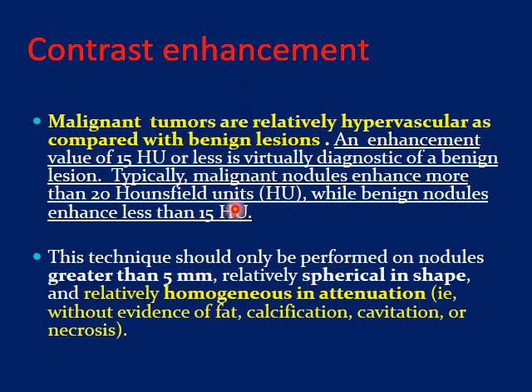Regarding contrast enhancement, we have two patterns: contrast enhancement and contrast opacification. What is meant by contrast opacification? It enhances markedly like vessels. I will show to you in few seconds. Actually, we don't do this.